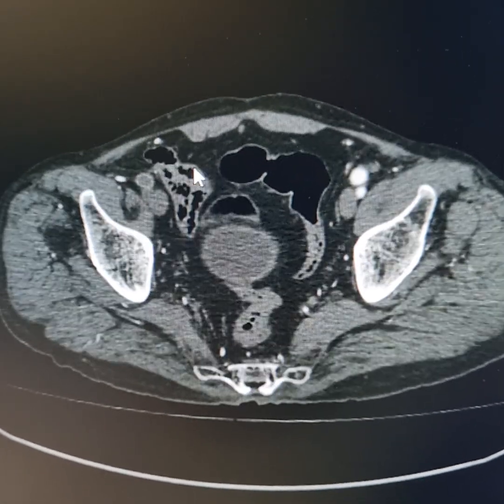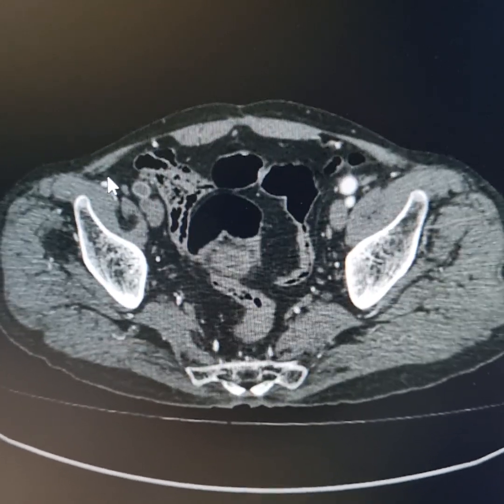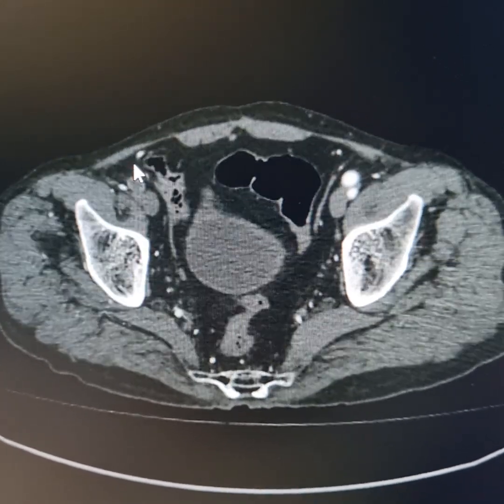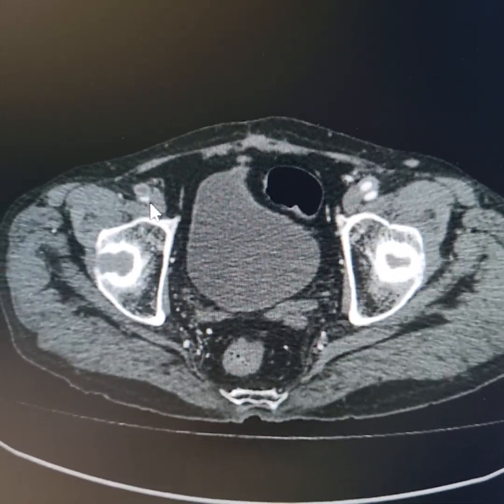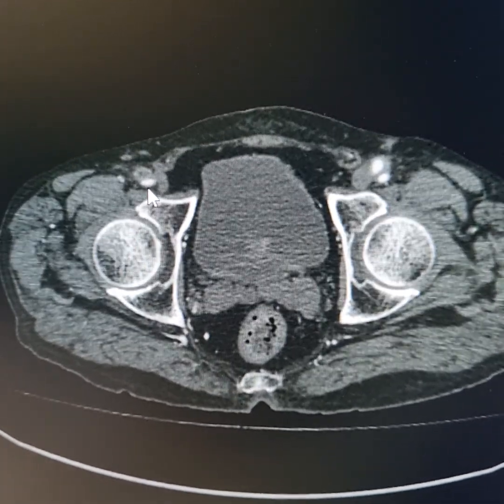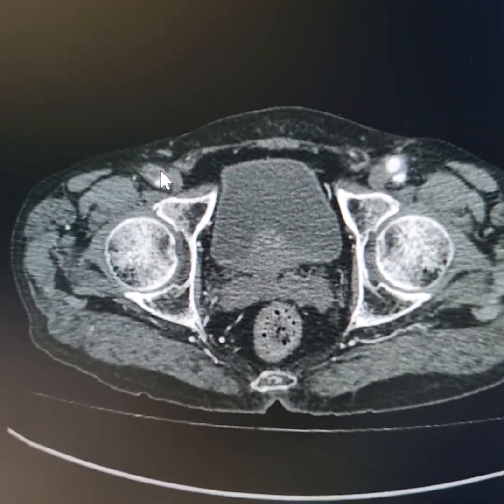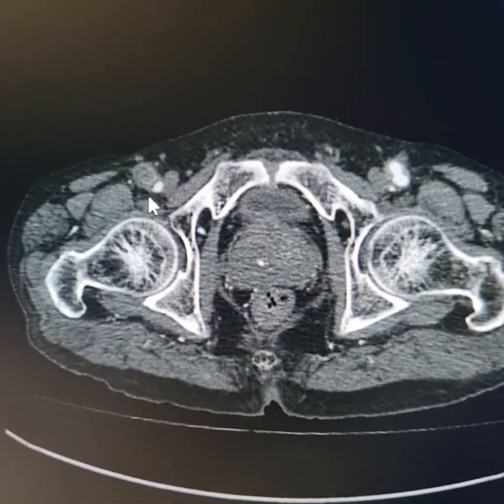Low down, this is the inferior epigastric artery. This is the superficial circumflex iliac artery. Both of these join the occluded external iliac artery. Now, this is the femoral artery, which is patent although its lumen is significantly narrowed. This is the graft here, which is completely thrombosed.